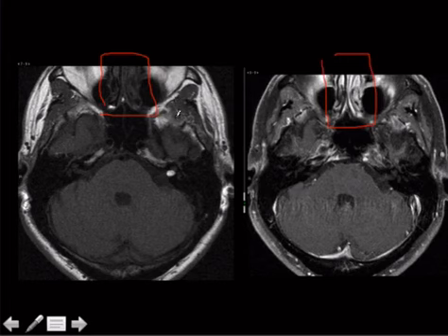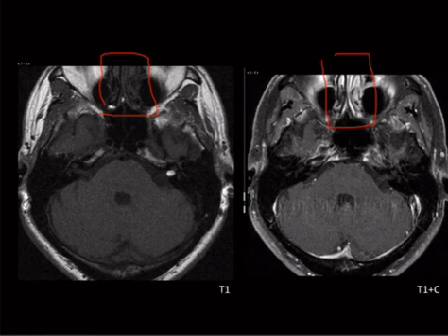If somebody wants to be a real jerk and not show you the vessels and make you figure out whether or not it's had contrast, sometimes they'll show you the nose. So look for the nasal mucosa to tell if there's been enhancement or not. And of course, when we do T1 post-con, just like in the abdomen, you often do it with fat sat, right? See the fat here? Notice it's satted out. All right, so that's important.